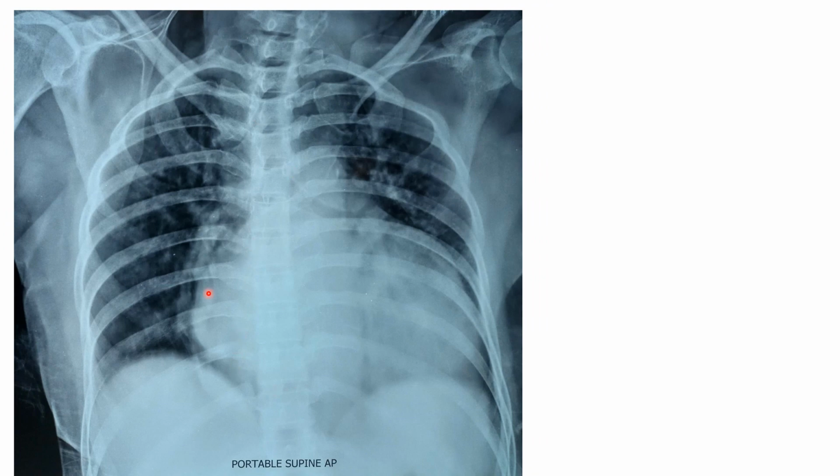Another x-ray, so again you have a cardiomegaly. It's very obvious this is the lung that is behind the cardiac shadow. Another finding is, you can see this trachea up here, and then it is dividing into right and left main bronchi. You can see that the carina is widened. You have to see multiple normal x-rays and carinal angles to appreciate this. So the carina appears widened. The widened carinal angle is especially due to the left atrial enlargement. Because of the pressure of the left atrium, it kind of widens.